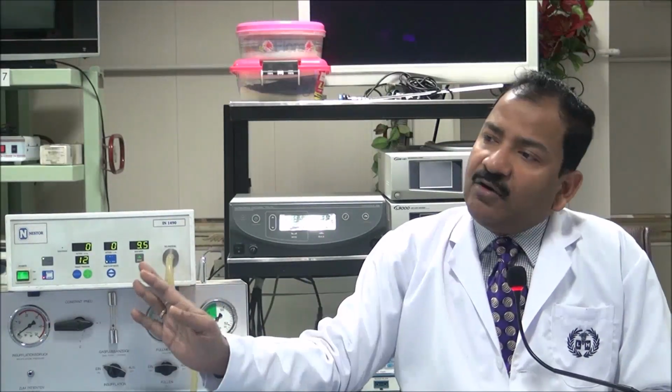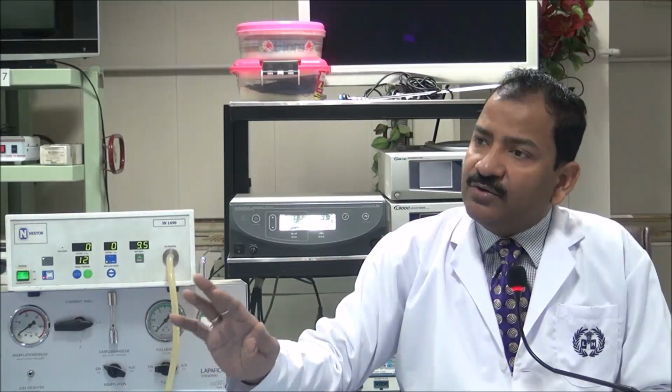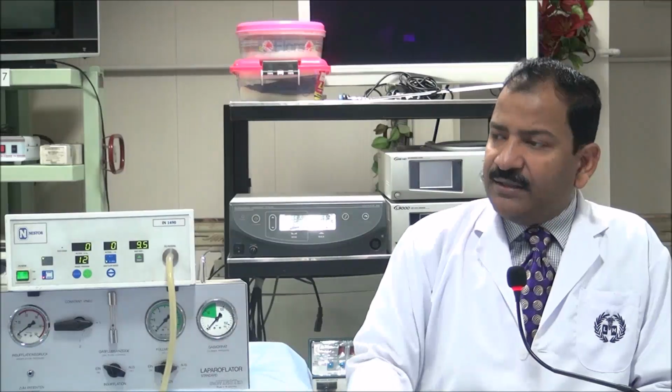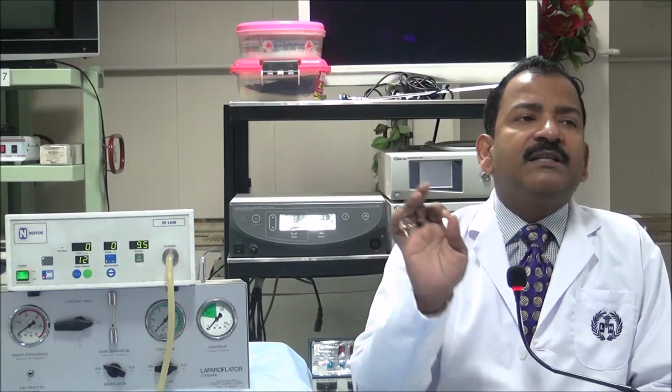Next variable is any space occupying lesion or any fluid in the peritoneal cavity. Like suppose a ruptured ectopic, already 2 liters of gas, blood was already there, then I can no more put more CO2. Or if there was a huge dermoid cyst or ovarian cyst, then also CO2 cannot be introduced more. So we should develop this intuition that once you come to the OT and your patient is lying on the table, just by palpating the patient's abdomen and seeing the size of the abdominal cavity, and then knowing the muscle relaxant and bowel position, you should be able to decide how much gas this patient needs.